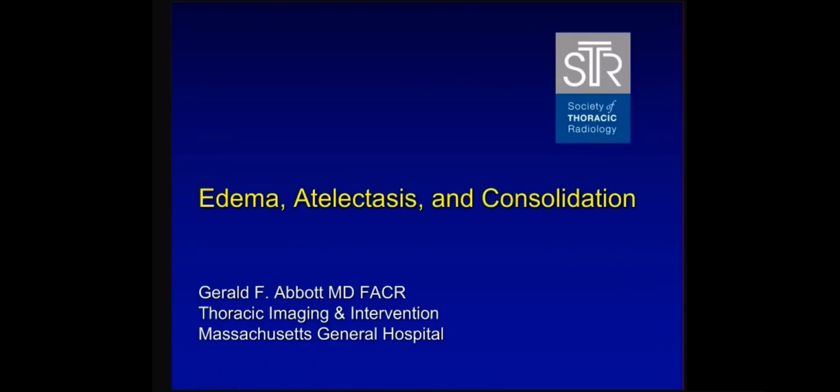So that's quite a quick tour of edema, atelectasis, and consolidation. Very common findings, as I've said, and you'll sometimes see these in combination, by the way. So I hope you'll find all these examples and the diagrams useful.